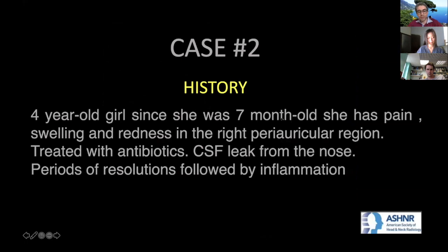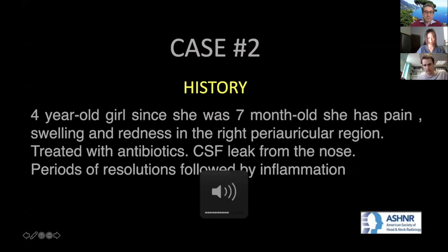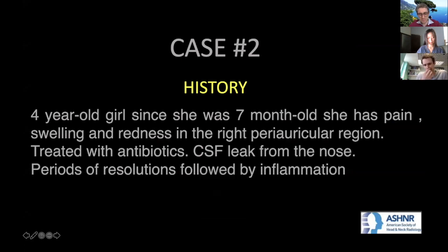Felice, before we move on to case 2, there are a couple of comments and questions here, from Asha Farmer, who had a question about the terminology. One of the issues here is that with Dr. Sennaroglu's existing classification, this would be called an IP1, but as we think of IP1s, there seems to be quite a range of anomalies from those with some external morphology to those with none.